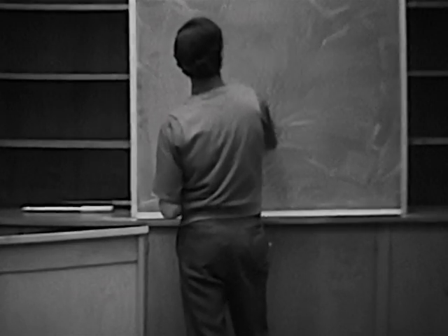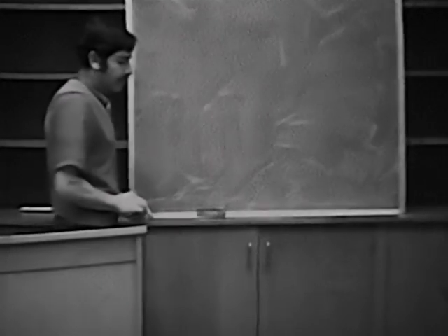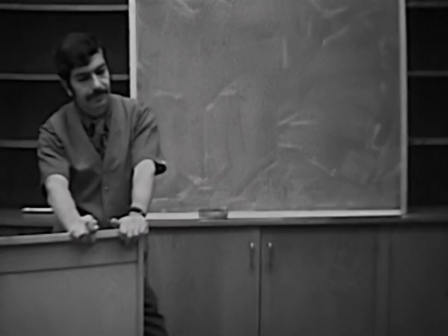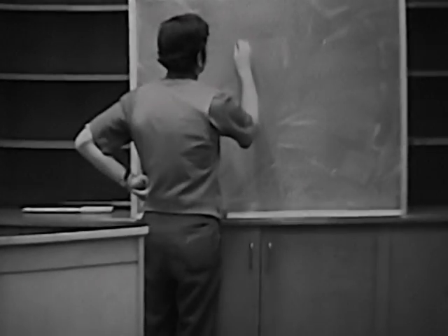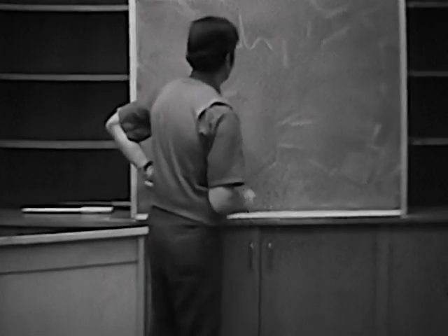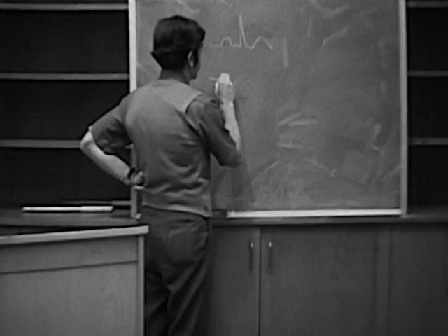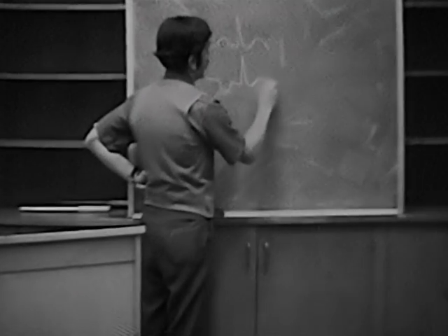Okay, now let's go down towards the node. We're not quite in the node yet. So we'll talk about some rhythms that are borderline between the SA and the AV node. Okay. Now here we have several situations. Okay, here's a normal atrial beat. Now our normal sequence. Now suppose you have something that looks like this. What kind of beat is this?